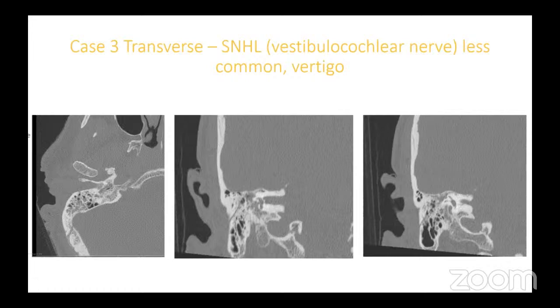Another case with transverse fracture of temporal bone, which can cause injury to the otic capsule, that can cause sensorineural hearing loss. It is less common, but can be seen on occasions.